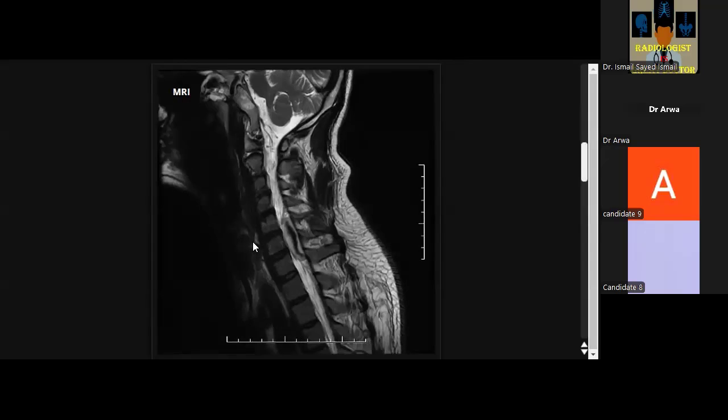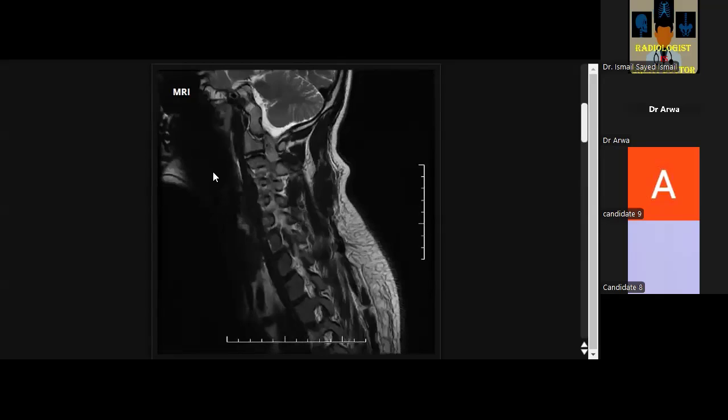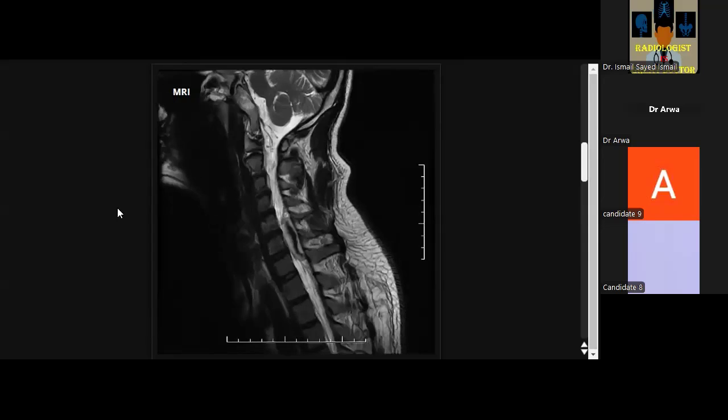Okay, I have been provided with sagittal T2 weighted sequences where I can see that there is a mixed signal intensity lesion in the posterior thecal space with the peripheral hyperintense signals and central low signals. Can you please scroll the images? Okay. And this lesion is actually displacing the dura anteriorly. It is causing compression of the cord. So I'll be really concerned about epidural hematoma in this patient, which is causing compression of the spinal column.